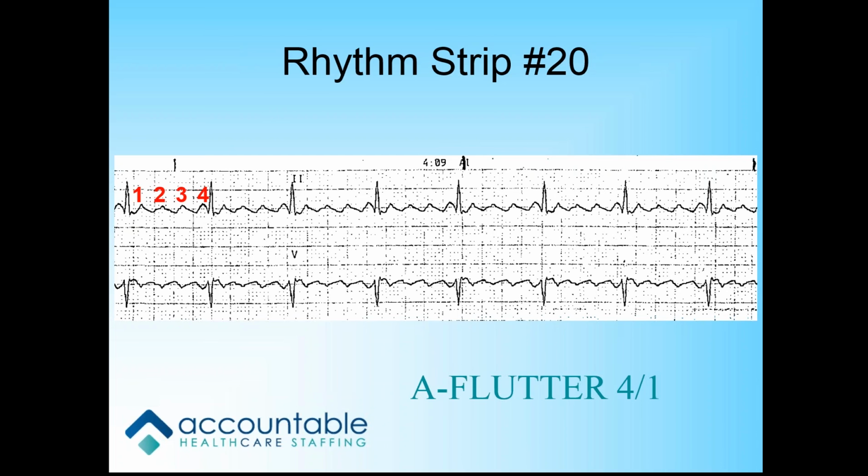And your main goal with this one is the same as with AFib. You're going to be doing rate control if there's any issues. On this particular patient, you'd be looking to see if they're symptomatic or not. Good job, Jessica. Okay, next.